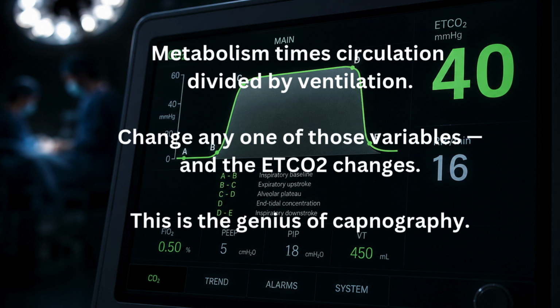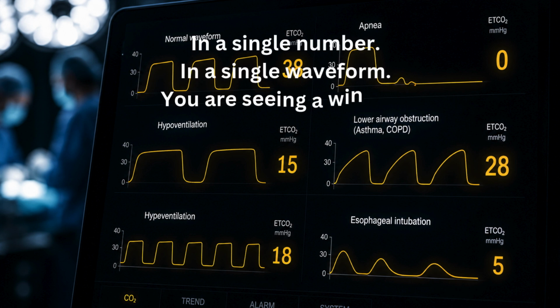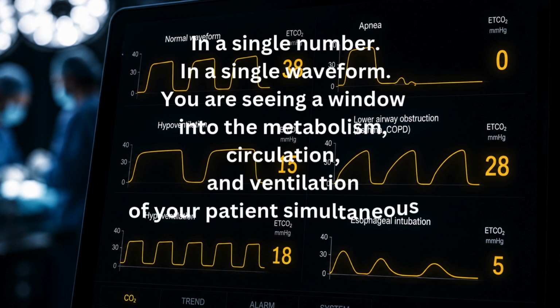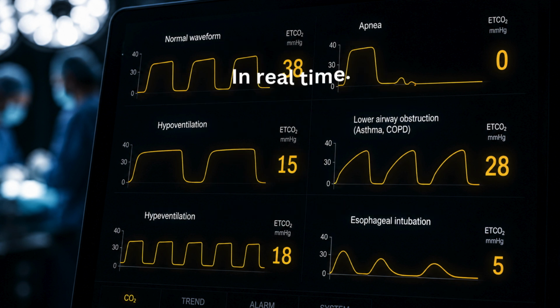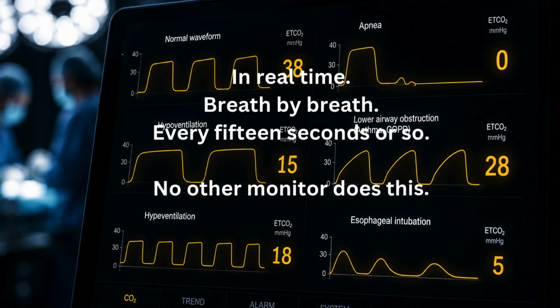This is the genius of capnography. In a single number, in a single waveform, you are seeing a window into the metabolism, circulation, and ventilation of your patient simultaneously, in real time, breath by breath, every 15 seconds or so. No other monitor does this.